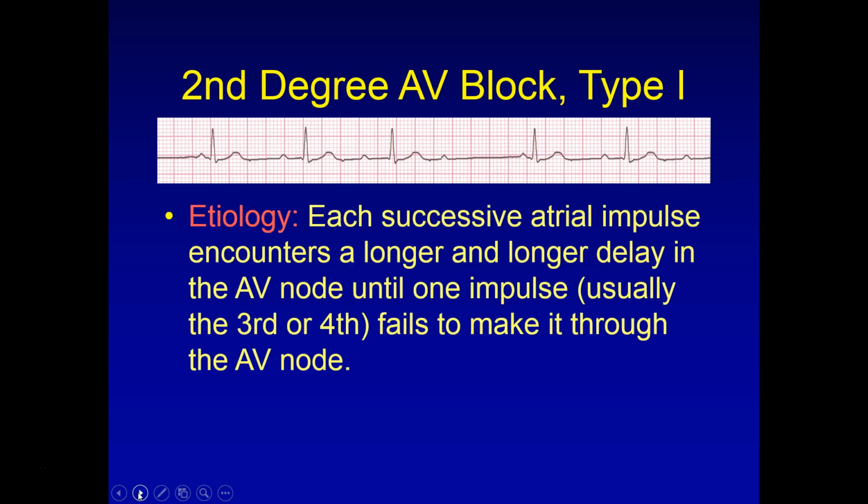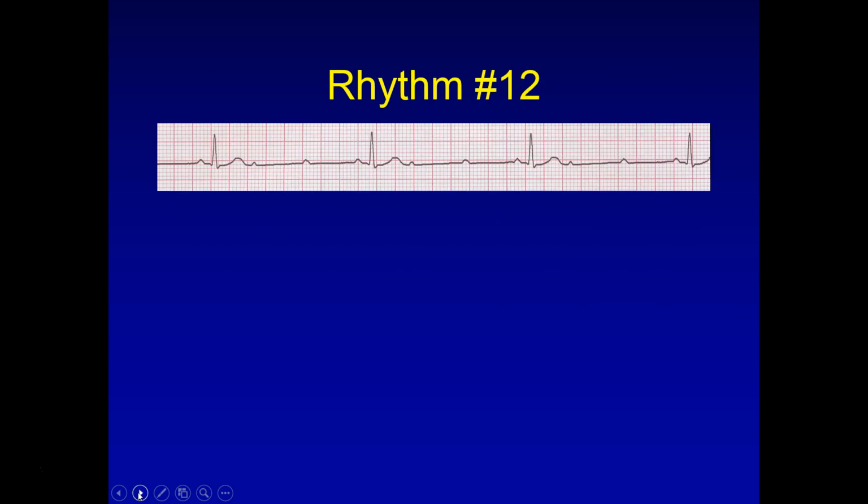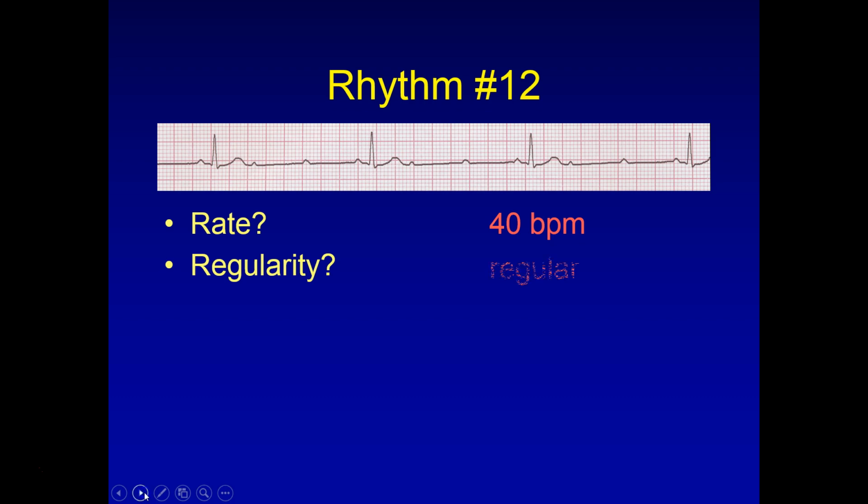All right, let's move on. So let's take a look at this one. What is the rate? It's 40 beats per minute. Is it regular? Yes, it's regular.